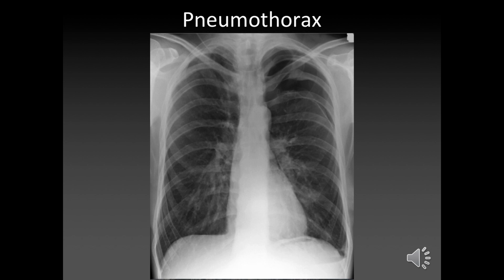This is one of the things that, as a junior doctor, you need to... Yeah, it's the left upper zone. Can everyone see that? Okay, so pneumothoraces are notoriously difficult to spot.